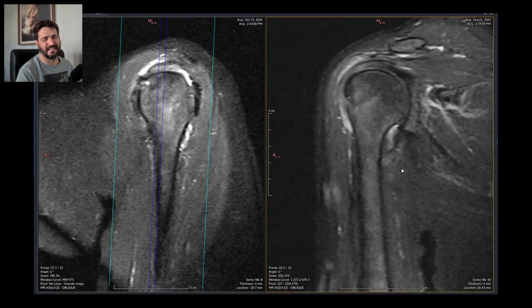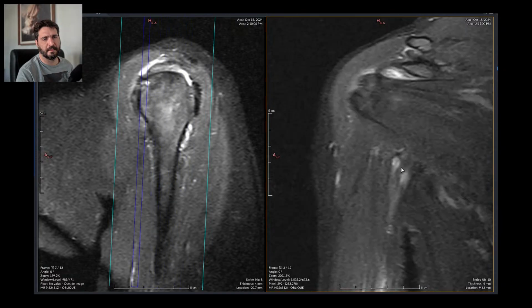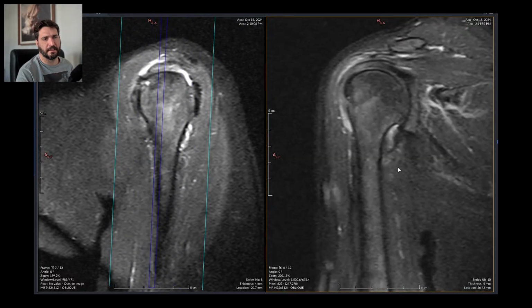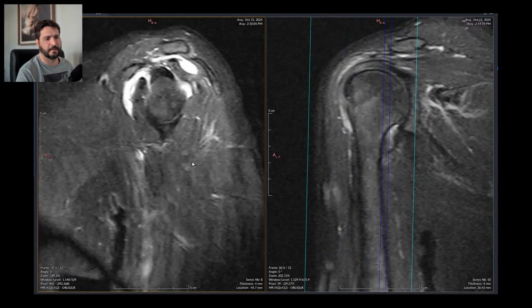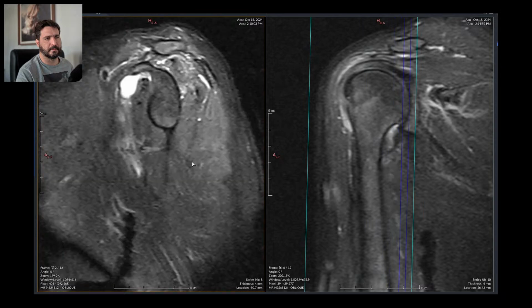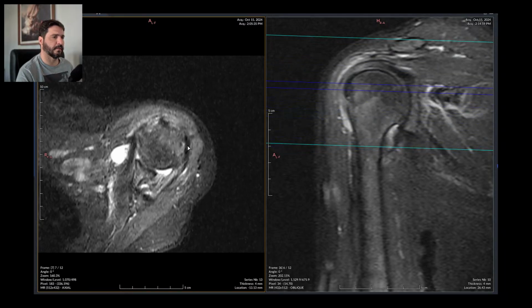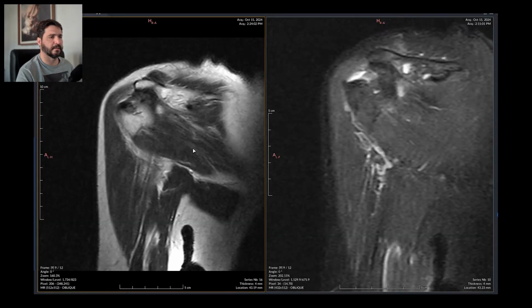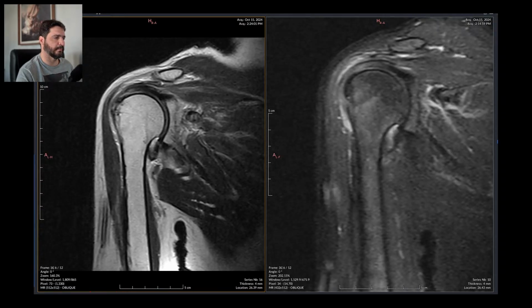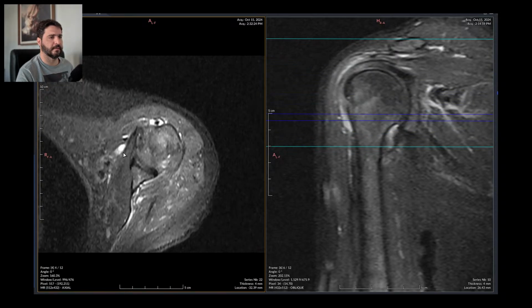This is a very low quality exam. This is probably a lower field scanner. It's really shaky, filled up with noise, and it gets worse because surely the patient is in a lot of pain, and could not stand still during this attempt of an exam.